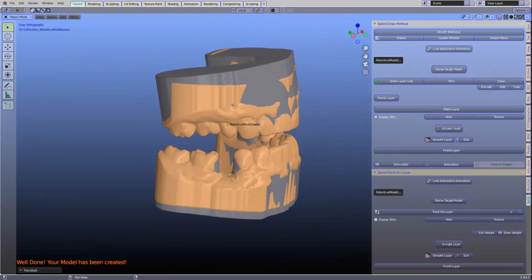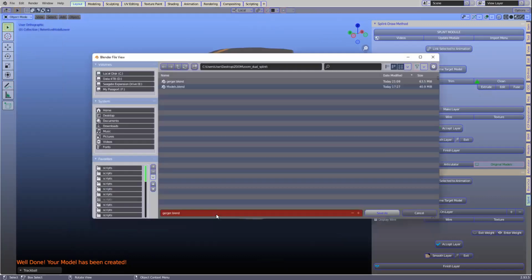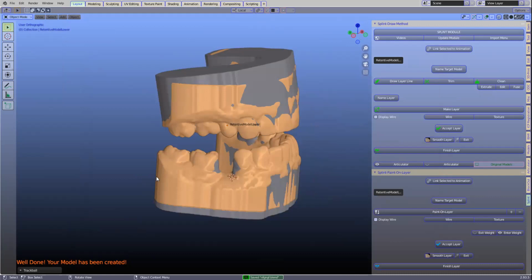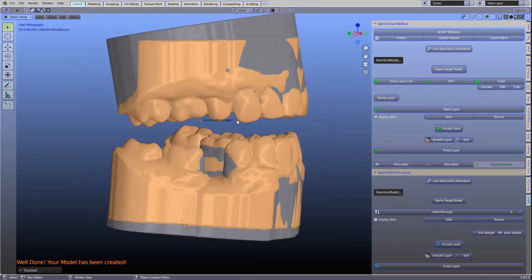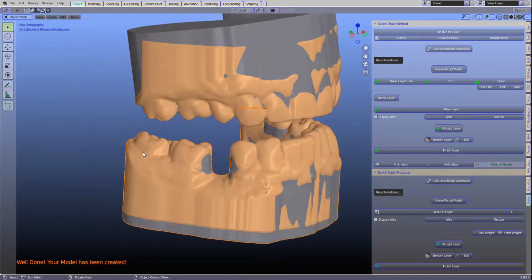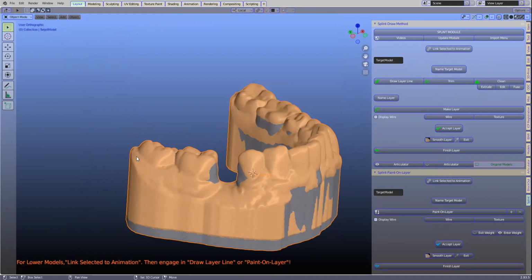Now we're going to go into the splint, because this is where we're going to make the layers. I'll just save in between. All right, now you need to sort of know how you're going to design your work. And this is the one that we've designed for Wolfgang, yours is a little bit different to other ones. Other ones cap over the top of the front teeth. Maybe you want to elaborate on that while I'm doing the design.